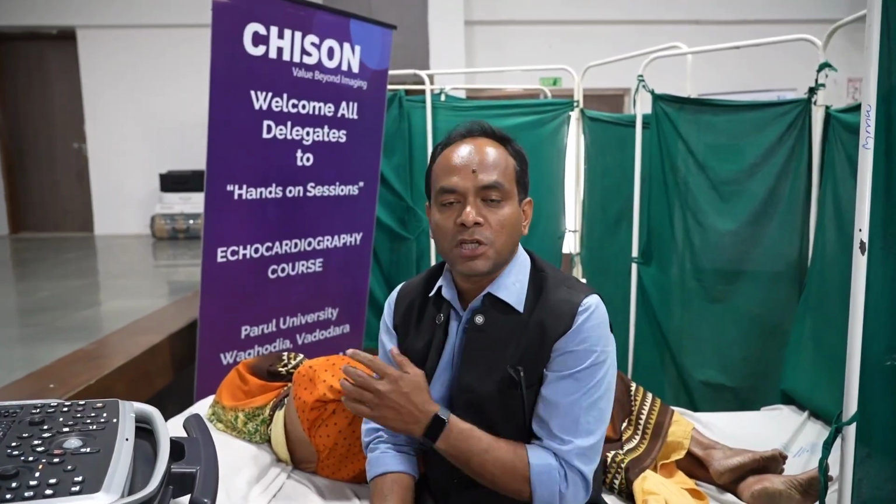So this was in short regarding some of the points like enlarged LA, deviated septum, and area of the jet in comparison to the LA area. All these things can help you the next time when you see such patients on 2D echo.